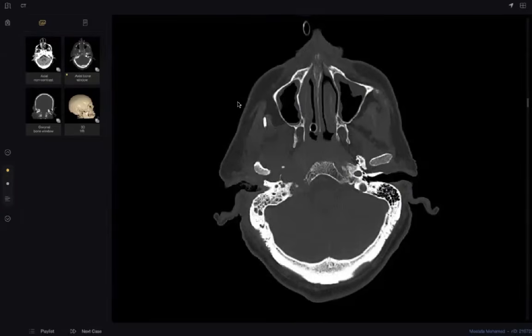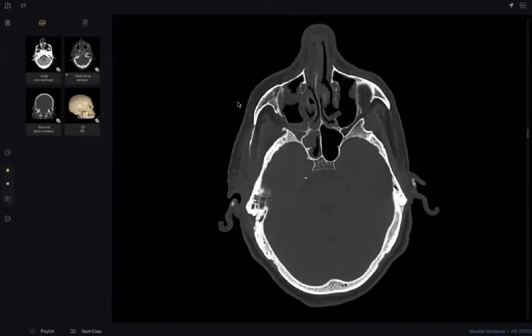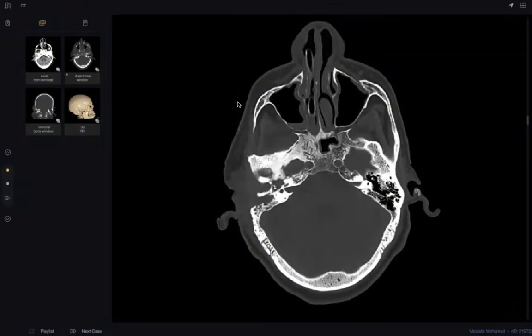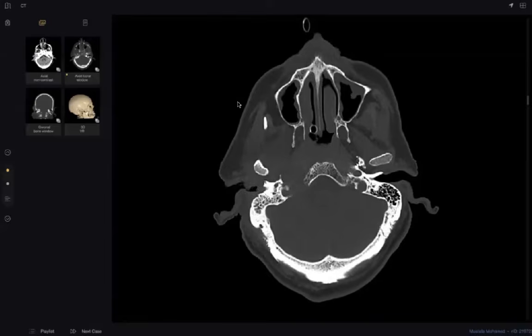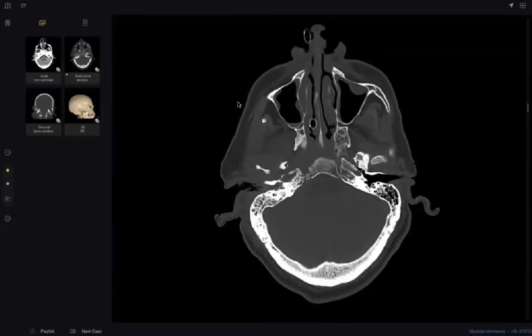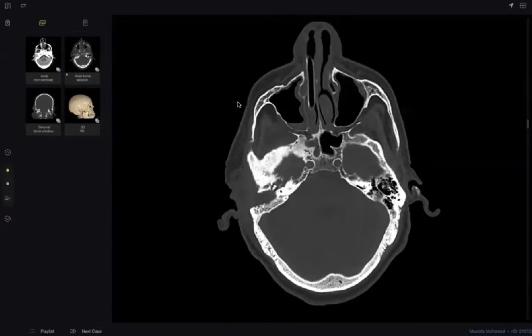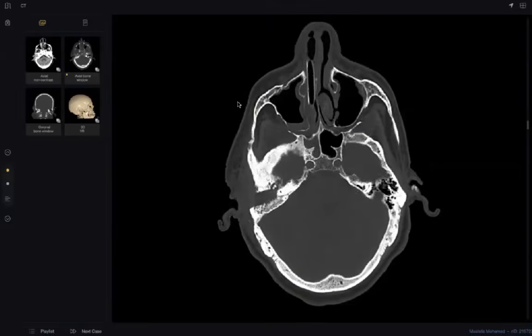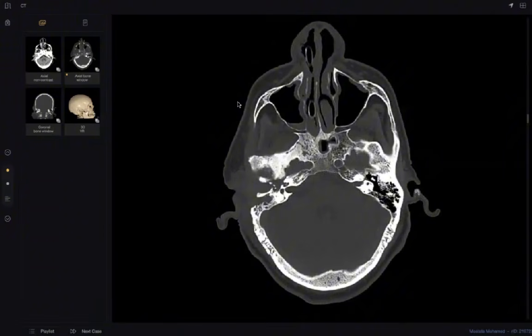There is also sclerosis of the sphenoid bone. I'll check the ear structures and the external auditory canal, which shows some partial obliteration. The inner ear structures are intact. Checking the middle ear, there is obliteration of the middle ear, yet I can still see the ossicles.